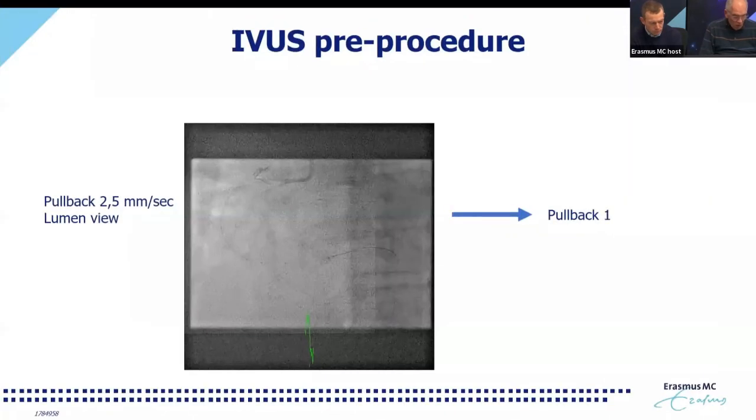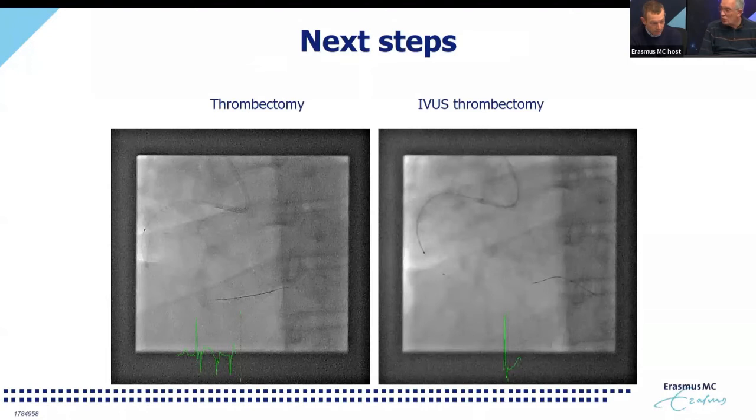Well, you want to place a stent, but where would you? Yeah, so this case was also included in the SPECTRUM study, which is a prospective observational study we're running now in the Thorax Center with the support of ACIST and MicroPort to look at the impact and consequences of contemporary stenting using HD IVUS in a consecutive cohort of 200 STEMI patients. We're well on the way with this trial, and this case was also enrolled.